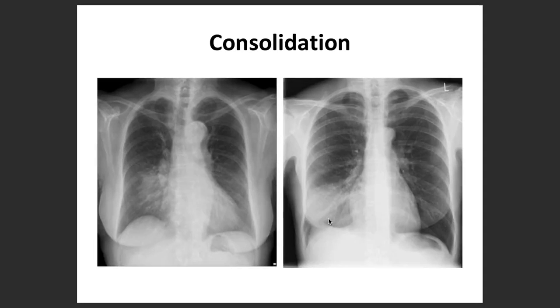For example, a child comes where the mother complains that the boy sniffed in some dust or some solid stuff as well, like this. So that is what you may be able to notice over here. And of course, it tends to correspond to the different lung fields as well.